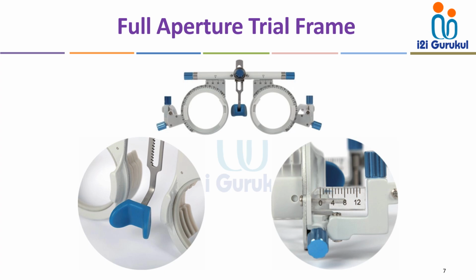So you can see in the image, this is the full aperture trial frame, where this is the vertical alignment. You can adjust the vertical alignment, and using these two knobs you can adjust the interpupillary distance, and these are the two knobs to rotate the axis. Along with this vertical alignment, you can adjust the back vertex distance with this knob.